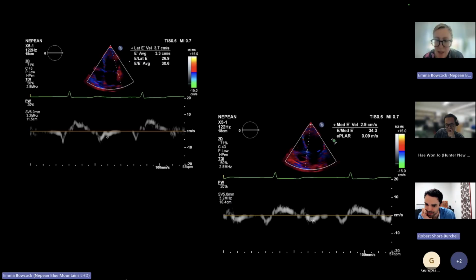Yeah, we'll come back to that. I agree with you, but this is often what you get when you're reporting these scans. You sometimes do want to go back and repeat the measurements, but sometimes this is what you've got to work with, and bad in equals bad out, but you've just got to work with what you've got and ignore the things that you think are inaccurate.